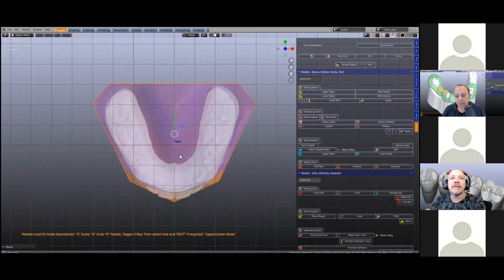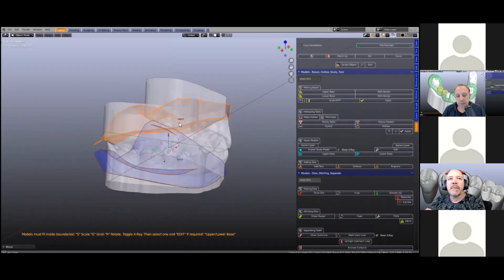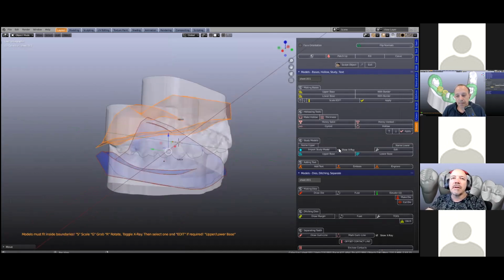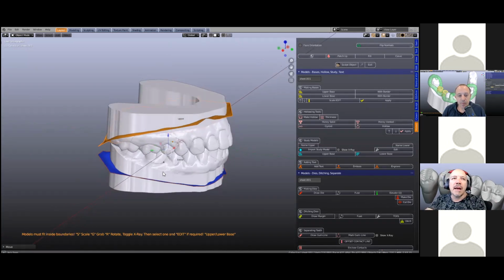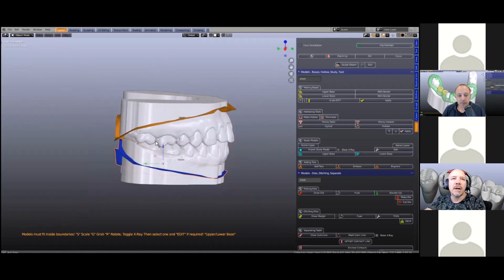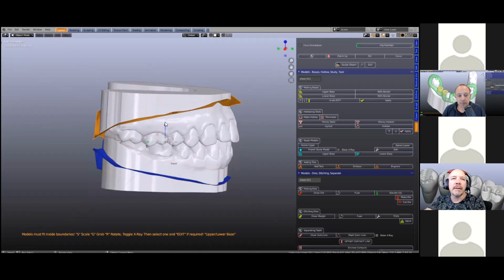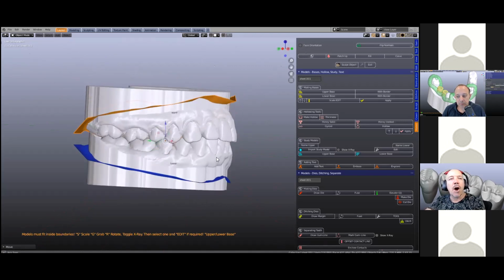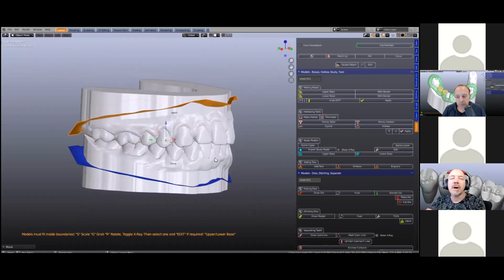So I'm going to view this from the side. You see everything's in transparent, which makes it hard to work with. So I'm going to uncheck this X-ray mark, and these little stencil things, we can move these up and down because we don't want the back molar being ripped off or something. Note that I've made a model before we've actually done the study models, so don't use an open scan mesh and then try and do it.